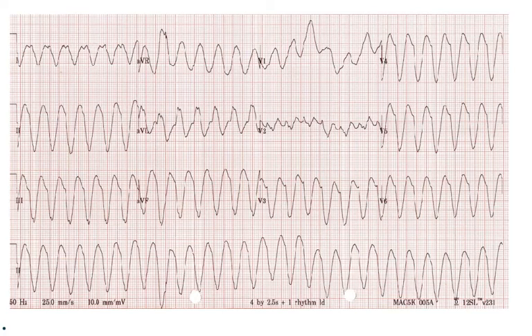Okay, now look at this ECG. Again, it is clearly tachycardia, but here the QRS complexes are very wide, right? So it is a broad complex tachycardia. Why is it important to know that it is a broad complex or narrow complex tachycardia? Because all the supraventricular tachycardias are narrow complex and all the ventricular tachycardias are broad complex. This is one main difference.